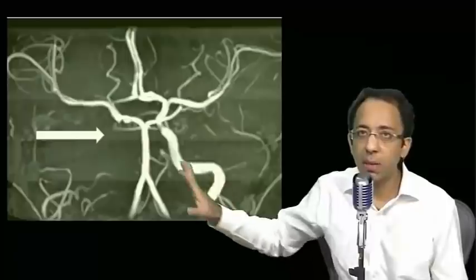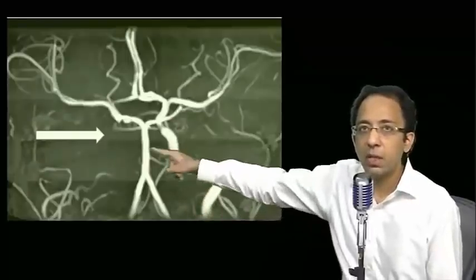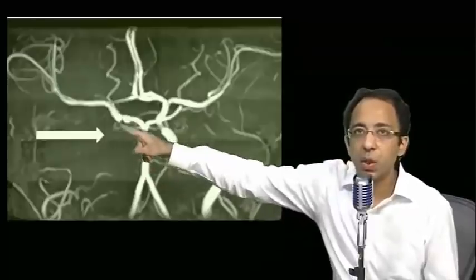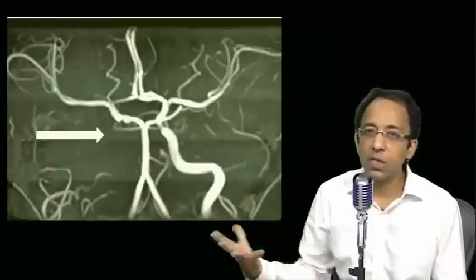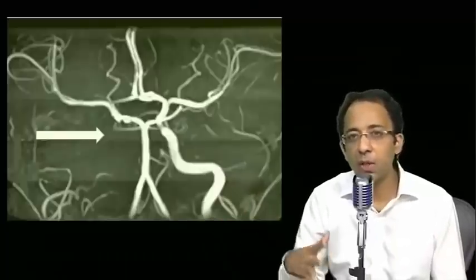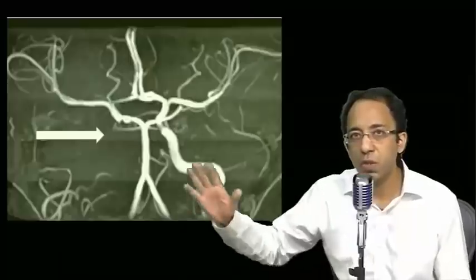And you can even have vascular thrombosis complicating it. So this is an MR angiogram. This is the internal carotid artery of one side. This is the basilar artery. The other side is all thrombosed. So the disease can involve the cavernous sinus, can also involve the internal carotid artery, and can lead to internal carotid artery thrombosis as well, which is what we see here.